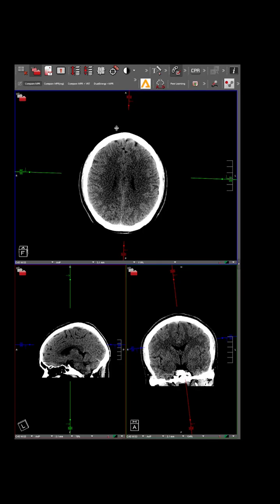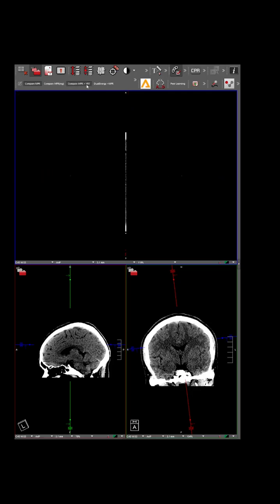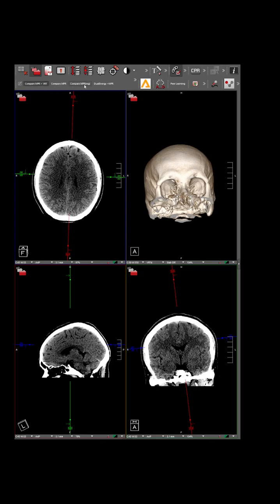If you want a specific thing to come up, like let's just say you wanted this to be the default, what you would do is you right click and say, make layout the only default, and then right click and hit save layout preferences. Okay, and now every time you load this sort of study, this will show up, and that's going to save you clicking through these to get to your preferred layout every time.